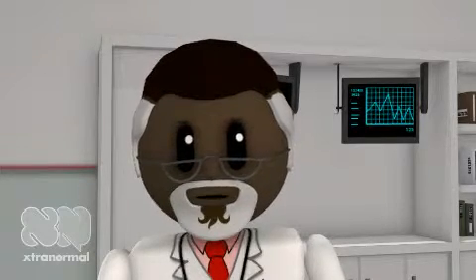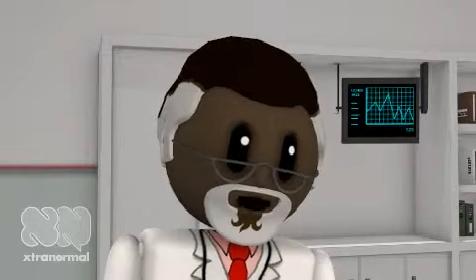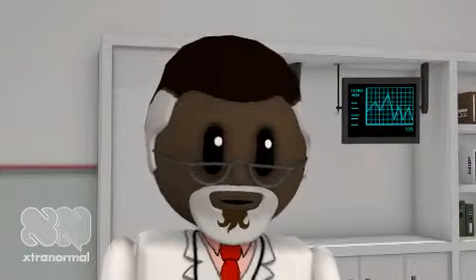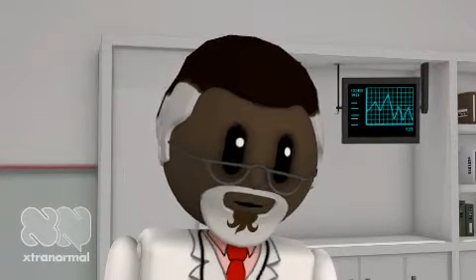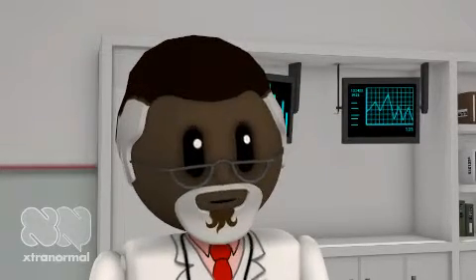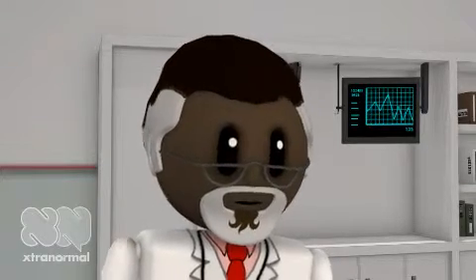Volume targeted assist control ventilation. Each ventilator breath is triggered by the patient. Flow time scalar is similar to control ventilation. Pressure time waveform differentiates a control breath from an assisted breath by the small negative deflection prior to the delivery of the mechanical breath. Volume time scalar shows fixed tidal volume being delivered.